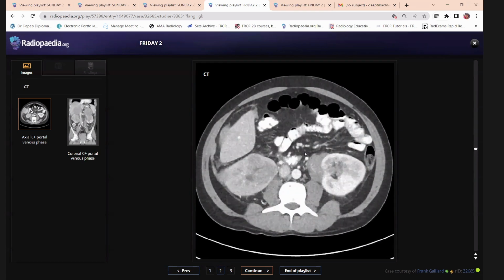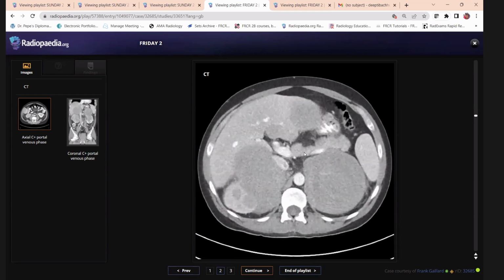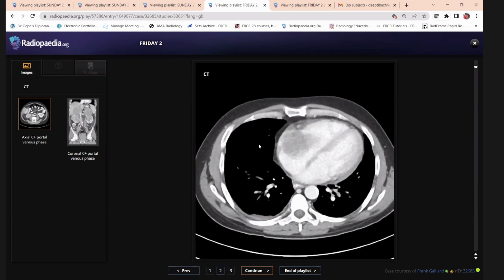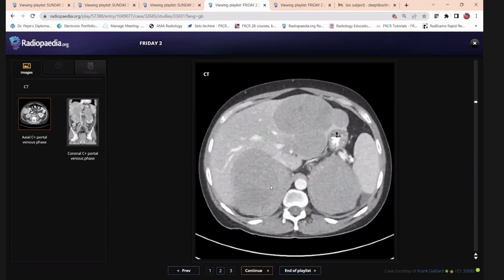Very good. And apart from that, you want to see something in the current imaging? What have you seen in the bone already? Of course, I'll review the bone for the presence of bone metastasis and the lung window for any lung lesion. And there is a mild left pleural effusion. Okay, fine. We'll go to the next case.